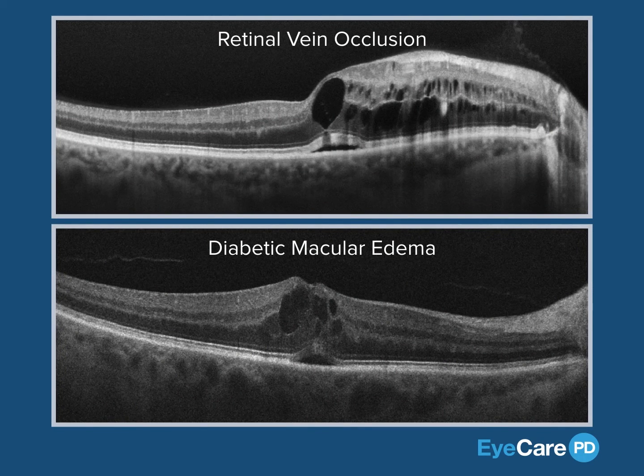Therefore, you should be able to distinguish macular edema secondary to a retinal vein occlusion from macular edema due to diabetes, where you see intraretinal fluid in a speckled configuration. This distinction should be relatively simple to make in most cases simply by OCT testing. Certainly there can be overlap, and clinical examination plus ancillary imaging is important, but an understanding of subtle OCT differentiations can make all the diagnostic difference.